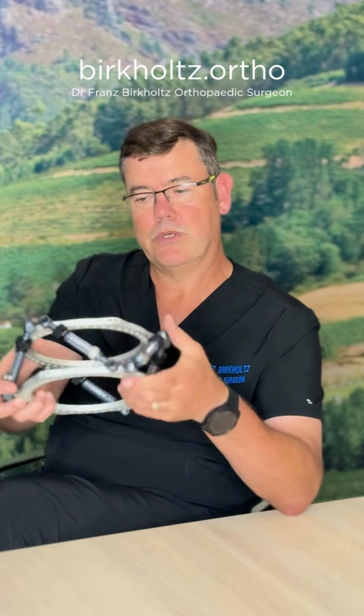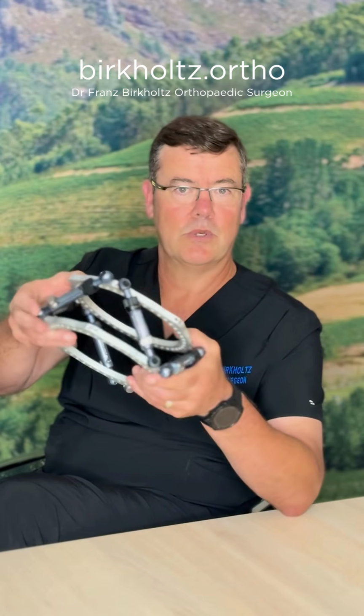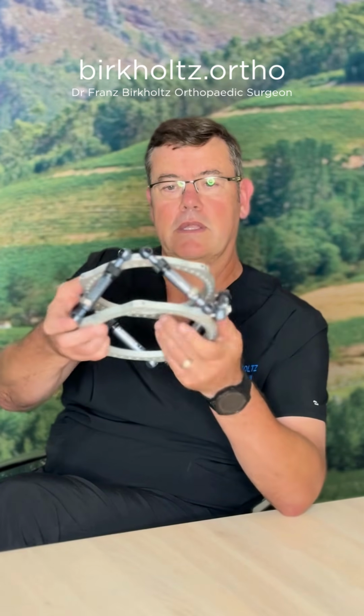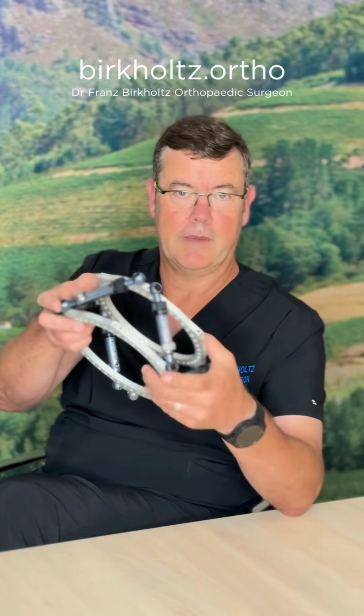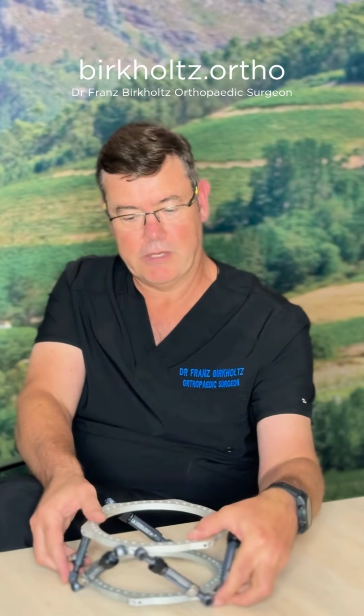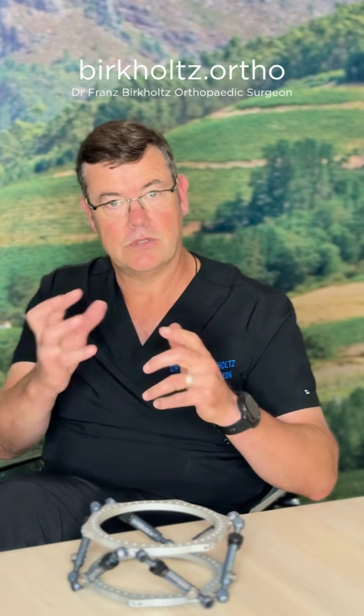Those of you who are engineeringly minded would recognize the strut stack as a Stewart-Gough platform, which is basically a specific platform that manipulates objects in 3-dimensional space. And of course, most of us are not clever enough to think of the algorithms that would be needed to adjust these struts in 3-dimensional space, so we use a computer program.